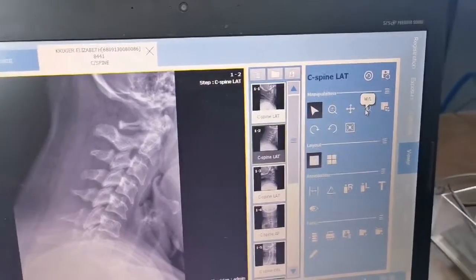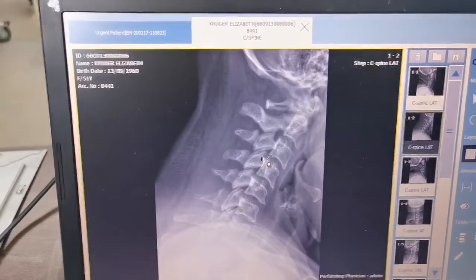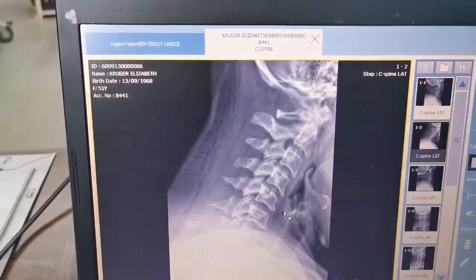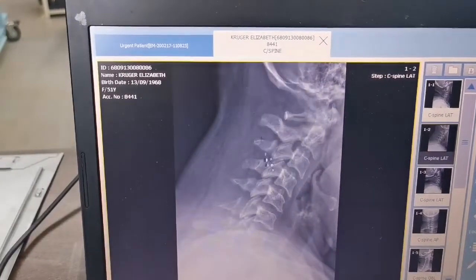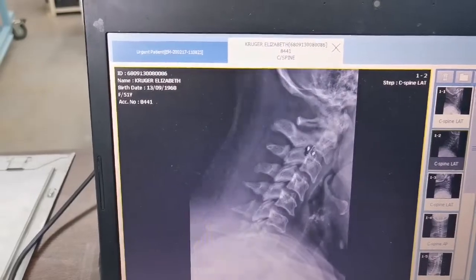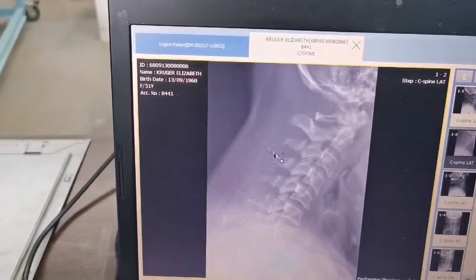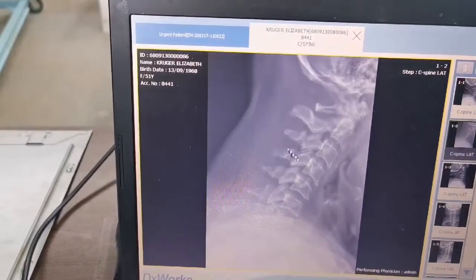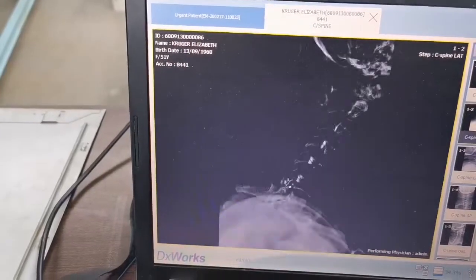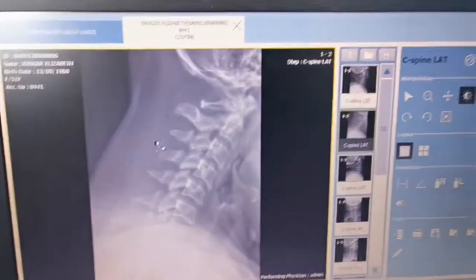And then we got the brightness and contrast control. Right mouse button is the brightness, left mouse button is the contrast. So left mouse button, if you see, you can pull it diagonal or that way around. So that way around is contrast, and from the left bottom to the right top is the brightness. As you can see, it changes the brightness as well as the contrast.